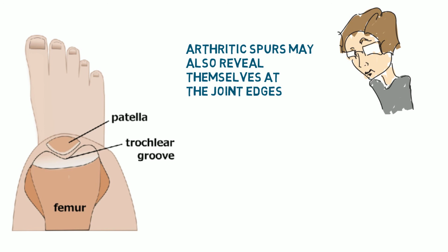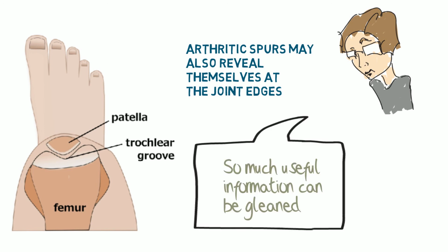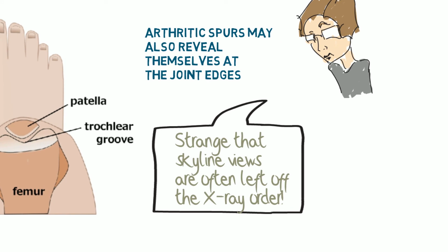There's so very much useful information that you can glean from a skyline view that it's very strange that it's so often left off the order. Knee surgeons in general would order at least these 3 views, and many would order as a routine the 4th view that we're going to discuss in part 4.